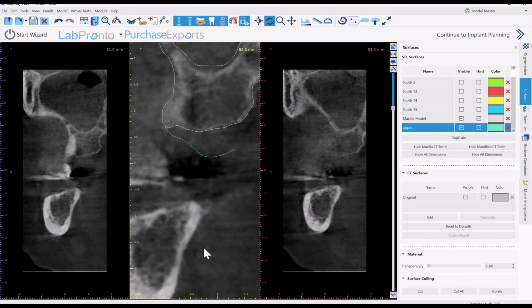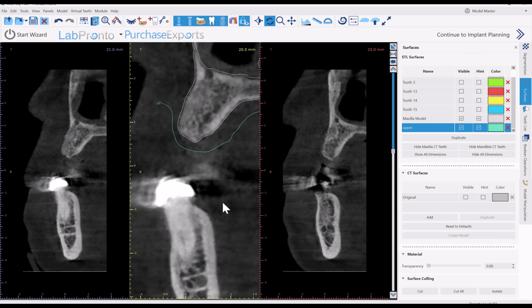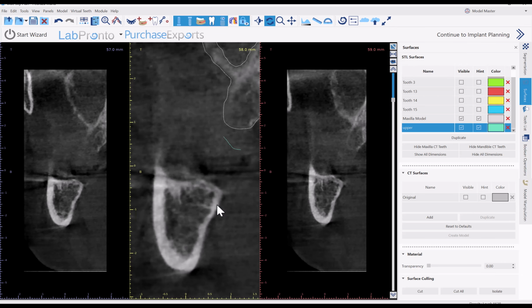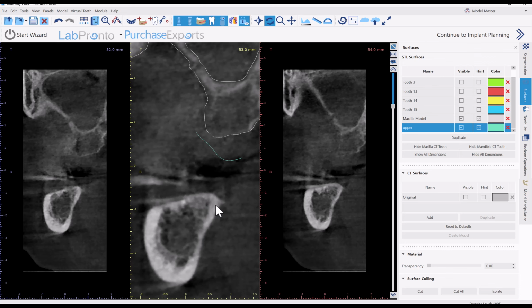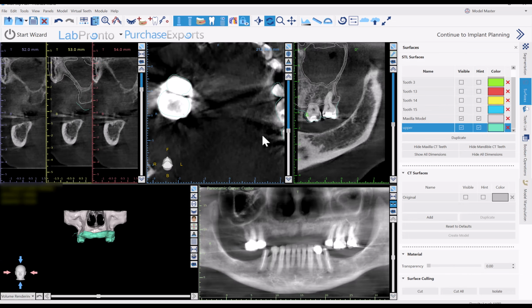But when you're trying to deal with a hard stitch in high scatter type situations, really a good idea to pack their cheeks full of gauze or cotton rolls or something to create those air pockets, because now you can not only depend on the tooth outlines, which are swallowed up by scatter, but you could also look at these tissue outlines. I've got just a little bit of an air pocket here, but it looks like that's tracking along it. Okay, so I'm going to somewhat trust this tentatively.